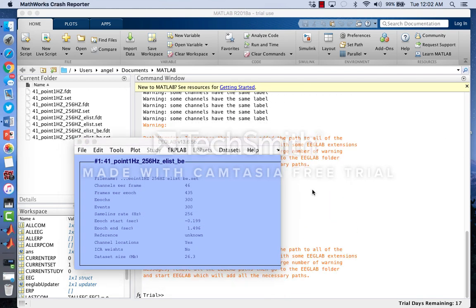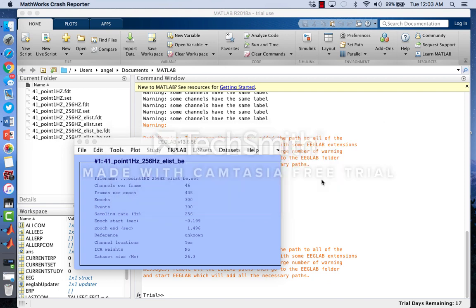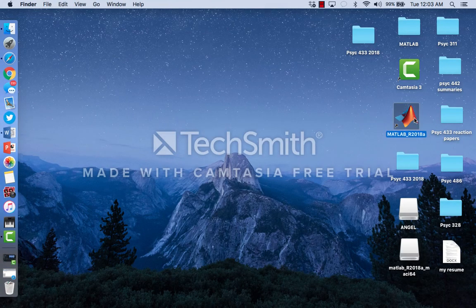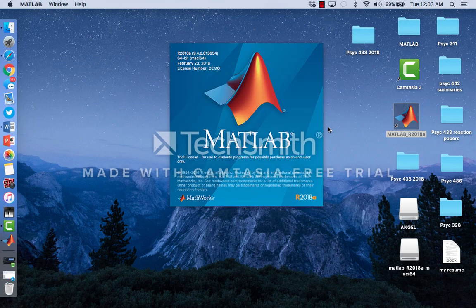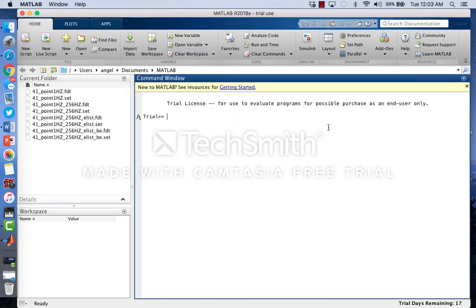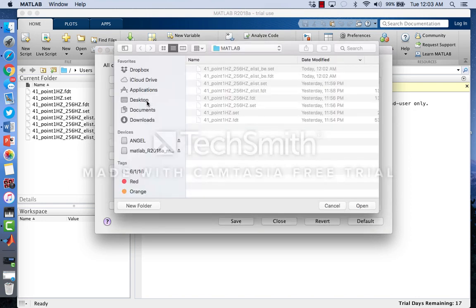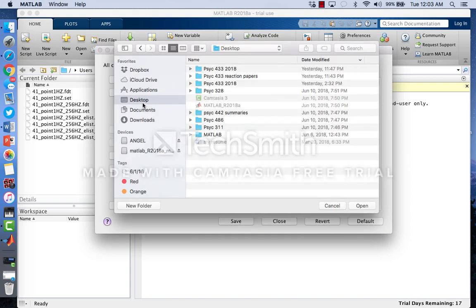Oh no. See, look, now we have another problem. See what I mean? That will do it, but it's fine. This is why we keep saving our stuff. And to be honest, you just have to have a lot of patience with this program. And just because, you never know, sometimes things just won't work. Or literally the little mistake that you do can ruin everything. And it'll just mess up everything for you. But honestly, this is where your patience comes in.